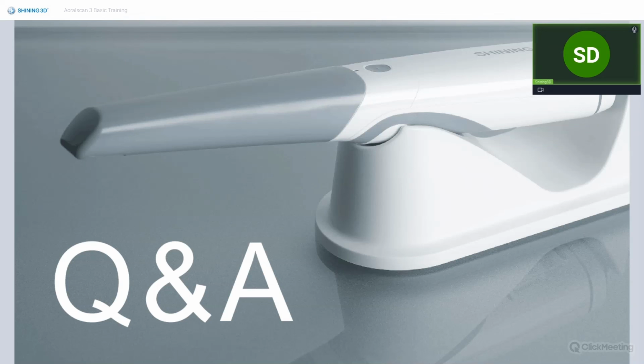This is the difficult point when we try to align different data. So if you are trying to scan for complete dentures or the full dentures case, you need to find a way to fix the gingiva. For example, in China, the doctors use something like a hook to fix the gingiva. This is the way to scan for full dentures.